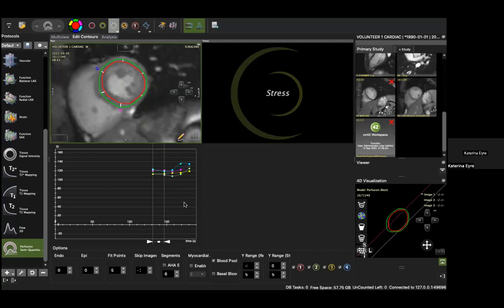And here we start to see something interesting. If you look at this graph on the bottom half, again, the y-axis is signal intensity units, the x-axis is time. These lines represent the change in signal intensity over time. What we're starting to see is a trend that we normally see from end hyperventilation, so the beginning of breath hold towards the end, a positive slope, a positive increase in signal intensity.